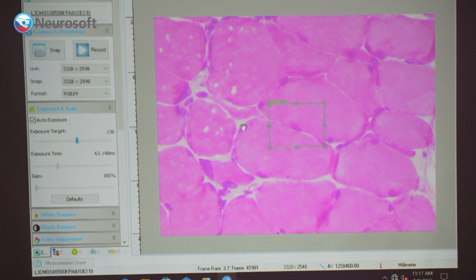I mean, unfortunately, this is not really informative. This can be, of course, neurogenic, early neurogenic, but this can be also kind of myopathy. Actually, I would have done the same thing as him because I would be worried about end stage proximally. Yeah, but a little bit higher at least. This is clearly normal, too mild.